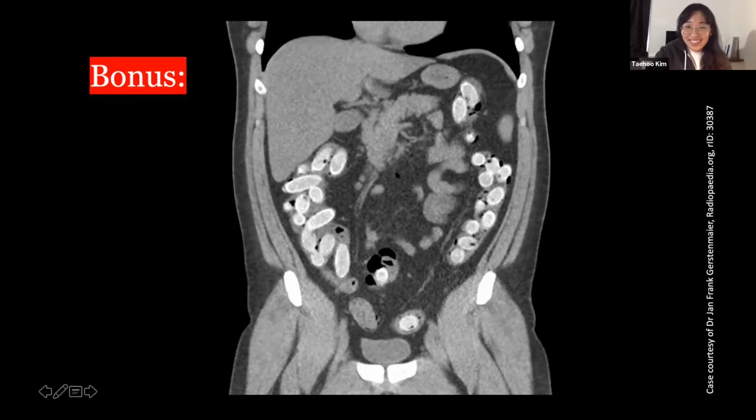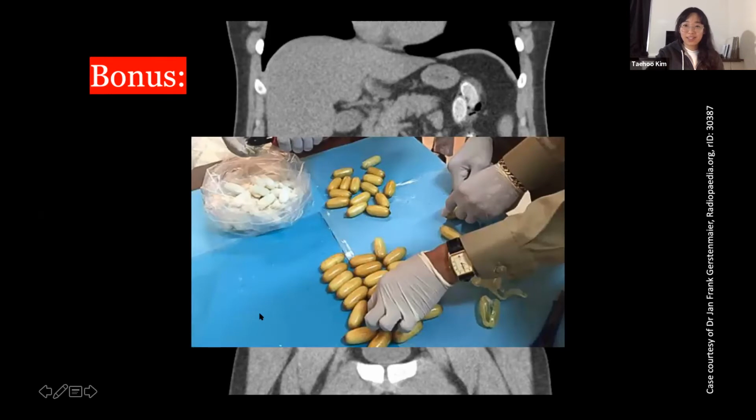Let's see what other people said. Yeah, the body packer. So you have multiple packed drugs in the colon. Yes, you're very good at finding these, good job. And then other things you have to look for, things we mentioned so far: free fluid, free air. Is there perforation? Is there free fluid? You have to look for those. This guy, I'm sure you presented earlier, there's nothing perfed. This is what they extracted in surgery. So I thought it was a cool case.